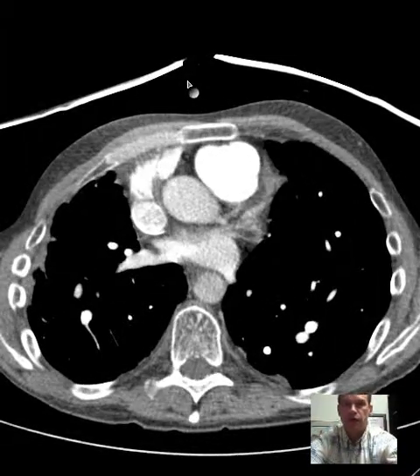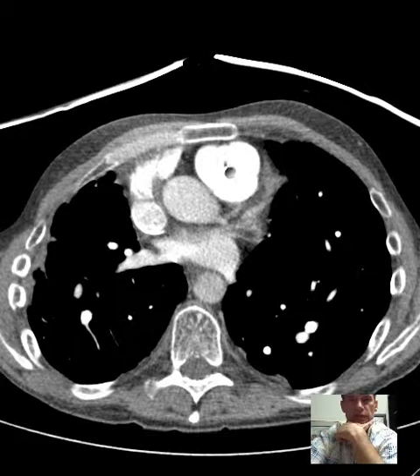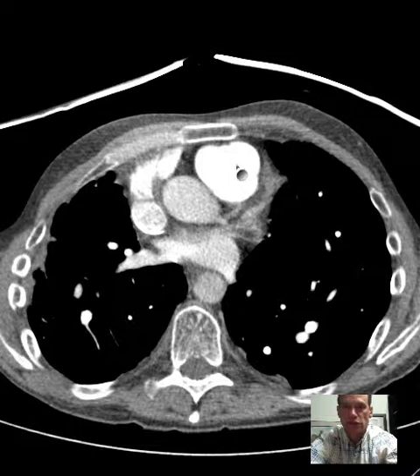And so if I were to point at this structure right here on a test, would you know what it is? If I were to point at this structure, would you know what it is? Well, let's look at this one first.